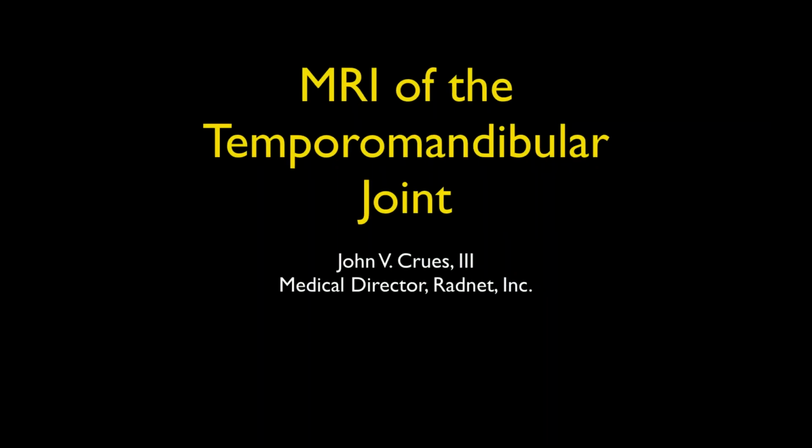So this is a joint, so I think it comes under the purview of musculoskeletal, though in highly subspecialized practices like ours, these are typically read by the head and neck radiologist. But a lot of the neuro people don't really like these. So let's just go through the anatomy of the temporomandibular joint.